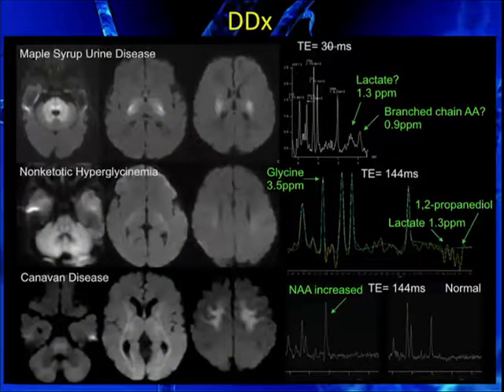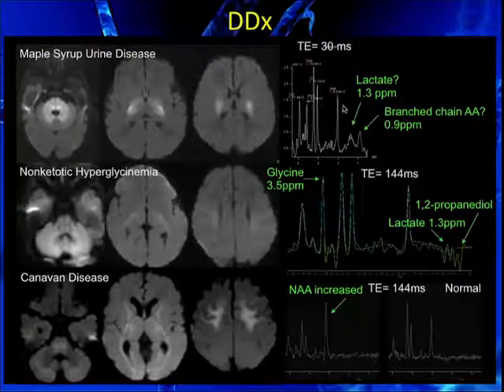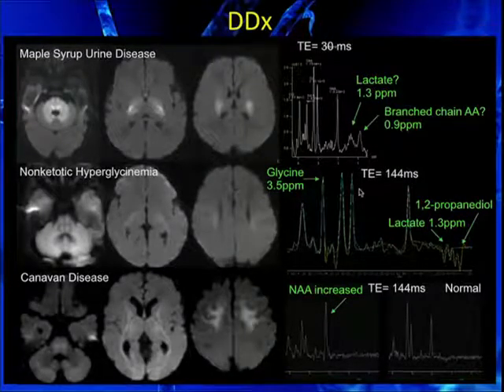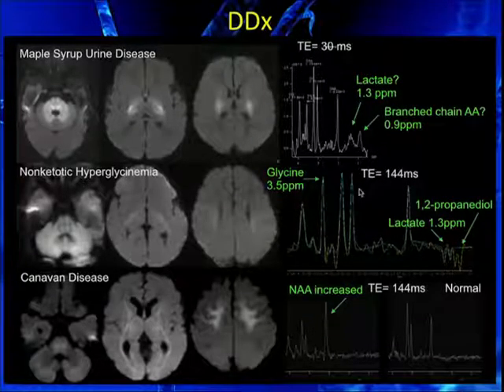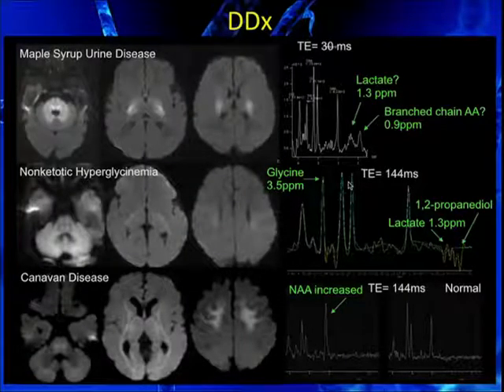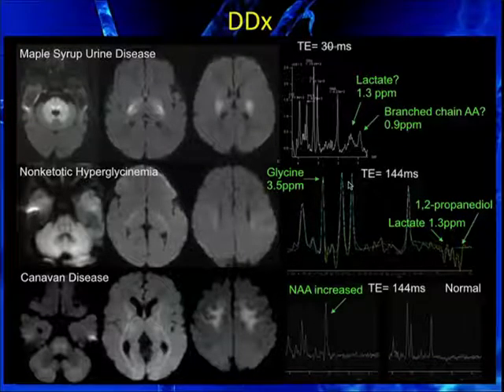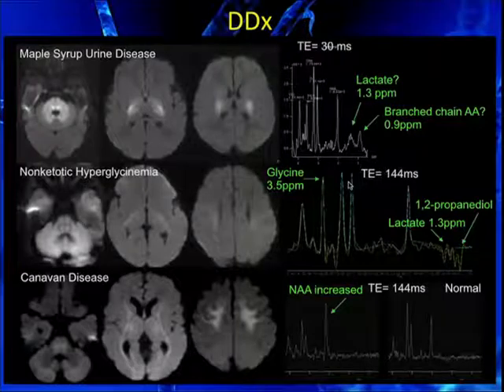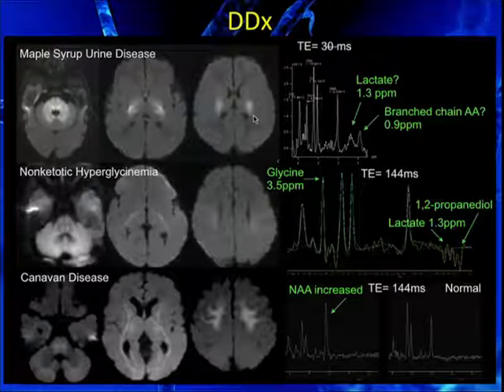And just to go on further, because there are lots of things that can mimic it, and if you're in a busy children's hospital, you see these things do come up. I was actually surprised, and the reason I put a lot of spectroscopy in here is I even had in our group, people saying, well, do we really need that spectroscopy sequence? Can we shorten it? Can we take out the spectroscopy? I find it to be very helpful, and you never know when it's going to be useful until you've already done it. So it's helpful to have it routinely to identify the potential metabolic disorders, in particular the mitochondrial ones, but also these other disorders that can mimic hypoxic ischemic injury.